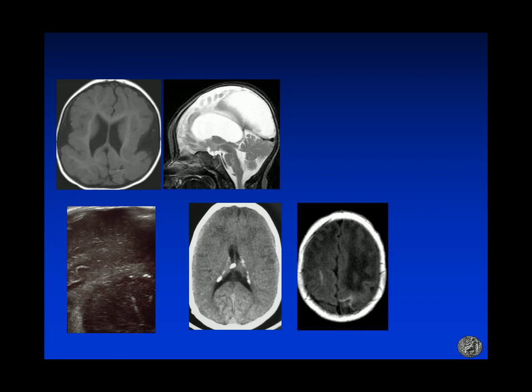Here you see 5 different patients. This is a T1 axial scan, and this is a full-term baby. It is about 8 months old, and you see that the brain is not normal. There is lack of operculization of the sylvian fissure, and here the cortex looks thick. So there is a problem of neuronal migration. Here, another baby with hydrocephalus, and this baby contracted infection in fetal life.